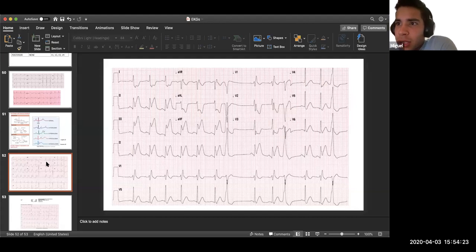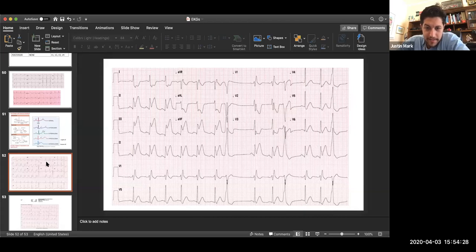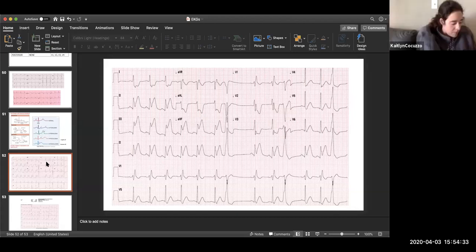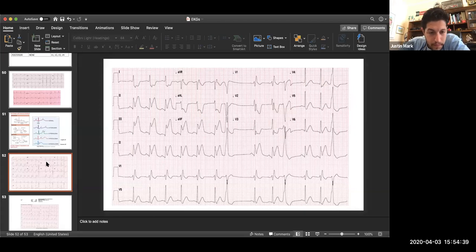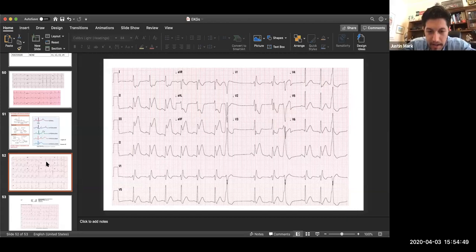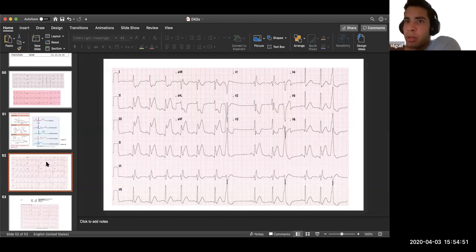So is it a right bundle branch block here? Okay, that's one thing. There's some irregularity as well. I see there's like, oh no, that's when it starts. Never mind. The rhythm's irregular, right? Regularly irregular. There's ST elevations in 2 and 3. The ST is actually taller than the QRS complex. There's also an escape rhythm here. Something's dropped. Look at V1 and V5. There's a big pause in the middle, and then another rhythm took over because you see different morphology.